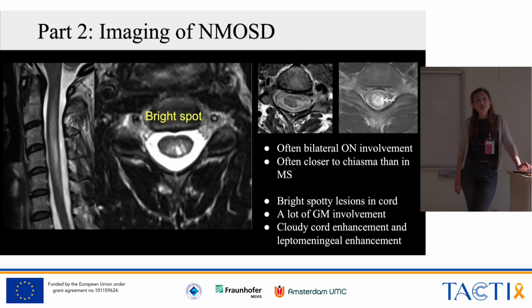And regarding the optic nerve, in MS we often see anterior small lesions, so lesions that are close to the eyeball, while in NMOSD we see more posterior, more symmetric lesions, very often at the chiasm. Oh, and by the way, often we also see brain lesion negative cases in NMOSD. So the brain is not really affected, it's relatively spared.